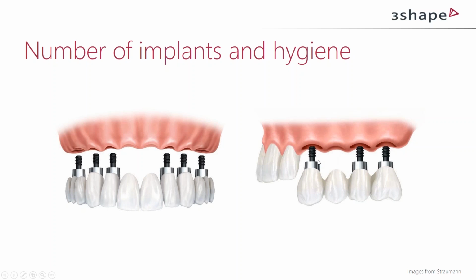Again, on the lateral side, we see that 3 implants don't have to be placed in the middle. We follow the teeth and we actually leave one out instead of placing number 4, which could jeopardize the whole construction. We leave this empty, so there is room for hygiene as well. This could basically be the solution to one of the previous 2D bite wing X-rays we saw, where 3 implants were placed very, very close together. Maybe 2 implants in position relative to the teeth, and then making a bridge construction with the pontic instead, could have been something to consider ahead of surgery.